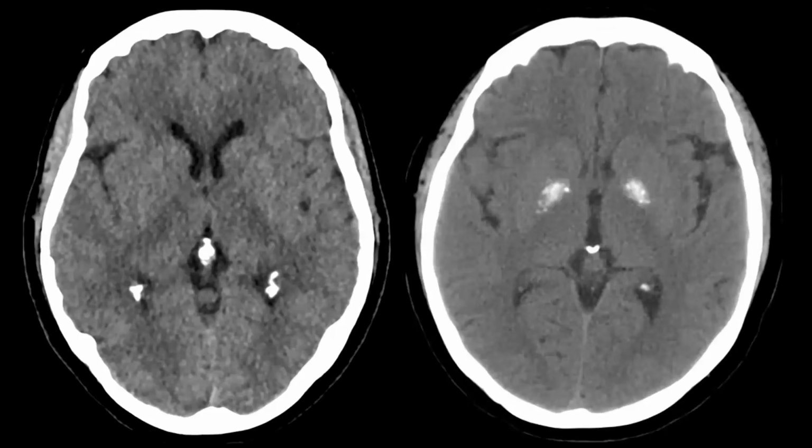There are some densities that are physiological, and you should not confuse them for pathology, as sometimes happens when a young resident is on call for the very first time and is afraid to miss something. I have seen this happen in practice. The patients are okay because nothing was wrong with them to begin with. What are typical examples of physiological hyperdensities?